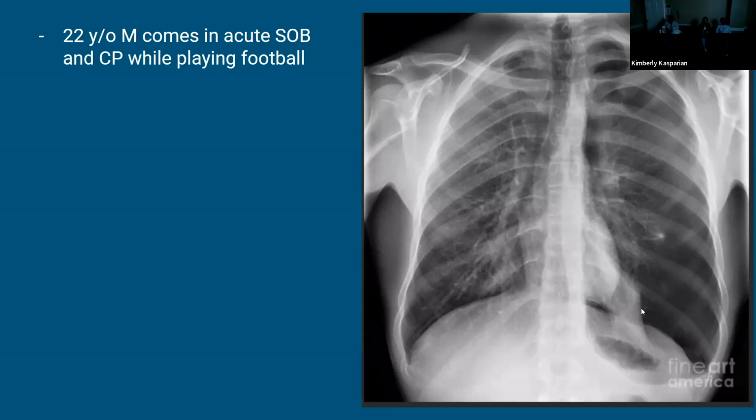The biggest thing, if you're ever considering clinically a pneumothorax: one, look at your picture, and you can see there is a difference between this lung and this one, like if you just look at it from 30,000 feet. And the biggest thing is you can trace these lung markings all the way out here, whereas on this side you start to trace and you lose them. Where's the rest of the lung tissue? It's collapsed down. So absolutely, that is a large pneumothorax.